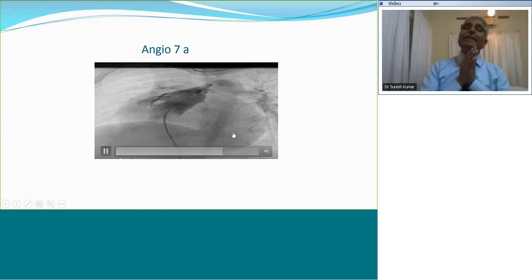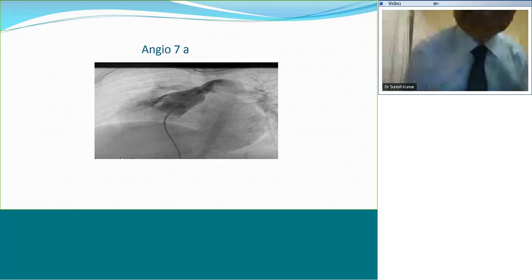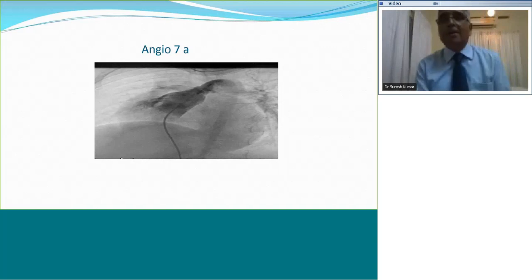So this is nature's hybrid stage 1 Norwood. What has nature done? Nature has given stenosis of both the origins of the pulmonary artery. Nature has kept the duct patent. So you didn't need to do a ductal stenting for this child. Do you get me? Here is a child with severe hypoplasia of the ascending aorta followed by coarctation and lower limb blood supply maintained by a ductus. You don't want that ductal flow to go into the pulmonary artery. So nature banded the pulmonary arteries too. So a very Norwood stage 1 hybrid-like situation provided by nature.